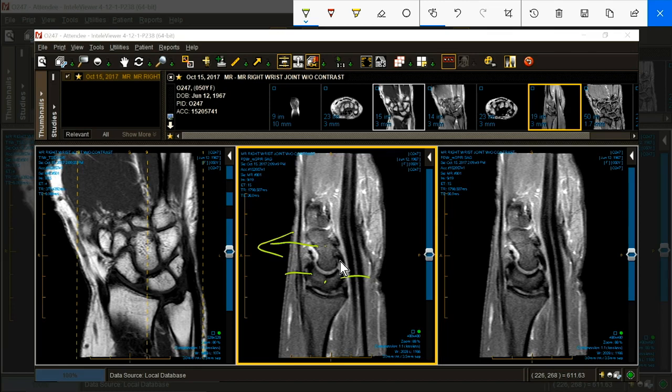That's plain radiographic stuff, but some of you are not MSK radiologists. So we've got VISI, DISI, lunate dislocation, perilunate dislocation. And then we've got the 45-degree angle of the scaphoid, which can alter if there is rotatory instability of the scaphoid. Let's go back now.